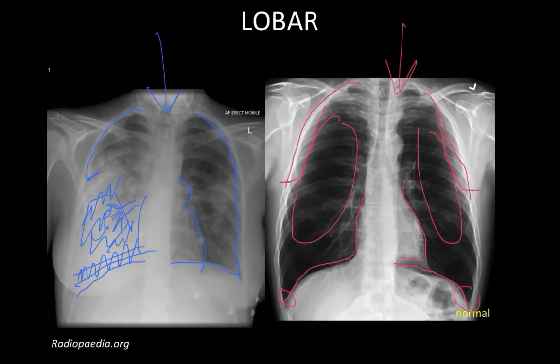There's a little bit of shadow on the left side, right here in the upper lung field. Of course, this can still be a pneumonia or an infiltrate, alveolar infiltrate, but it's not clear just from this picture. Another question that you probably would be thinking about, is this all a consolidation or is there an effusion that I'm not seeing?